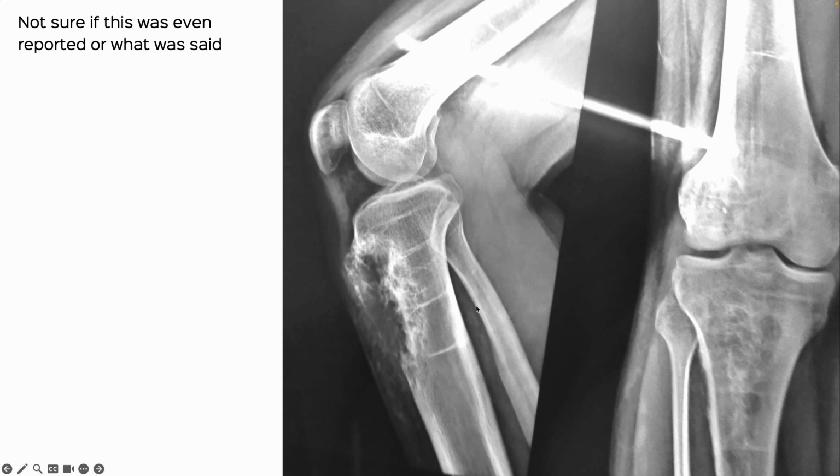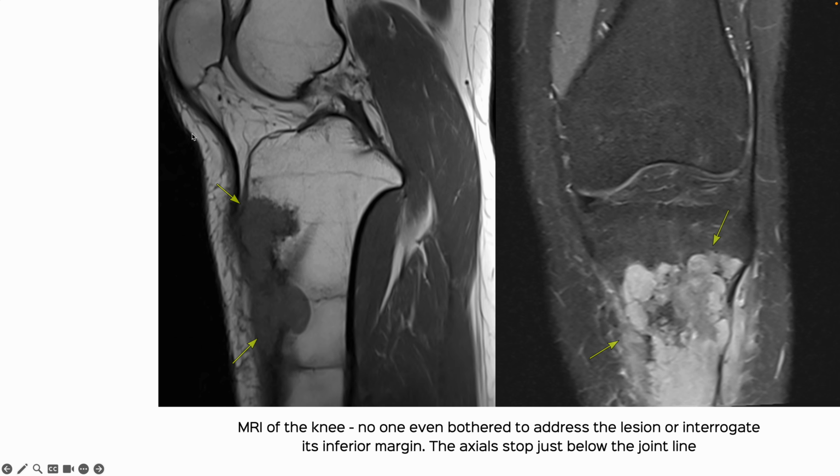And here you see this focal lesion, and I'll just leave it here for a minute. Now this is the MR. It came as an MR knee. So there are 5 sequences, none of which cover the bottom of this lesion. The axial images end somewhere here, and this is what we have.